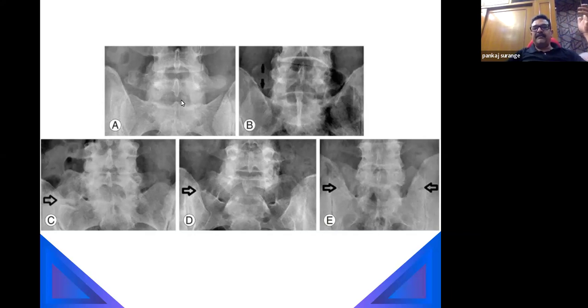So it is behaving like an independent vertebral body. All the movements are happening, and we have a proper disc over here. The joints are not forming a neo-joint. So it is behaving like an independent vertebral body, and the movements are happening smoothly. These kinds of conditions will not cause any pain because of the lumbarization or sacralization of the vertebral bodies. But if you see here, there's a partial fusion happening with the ilium. So these kinds of conditions may cause arthritic changes and may cause pain over there.